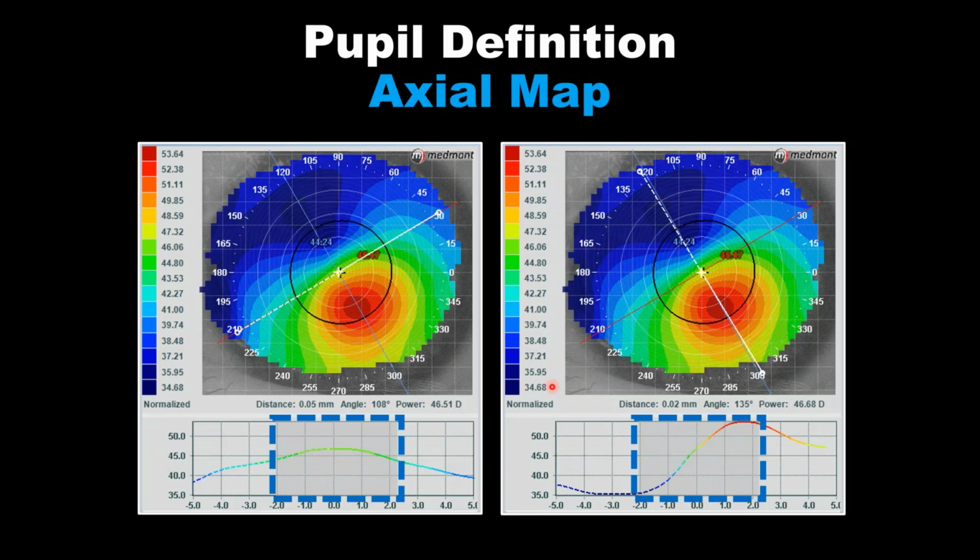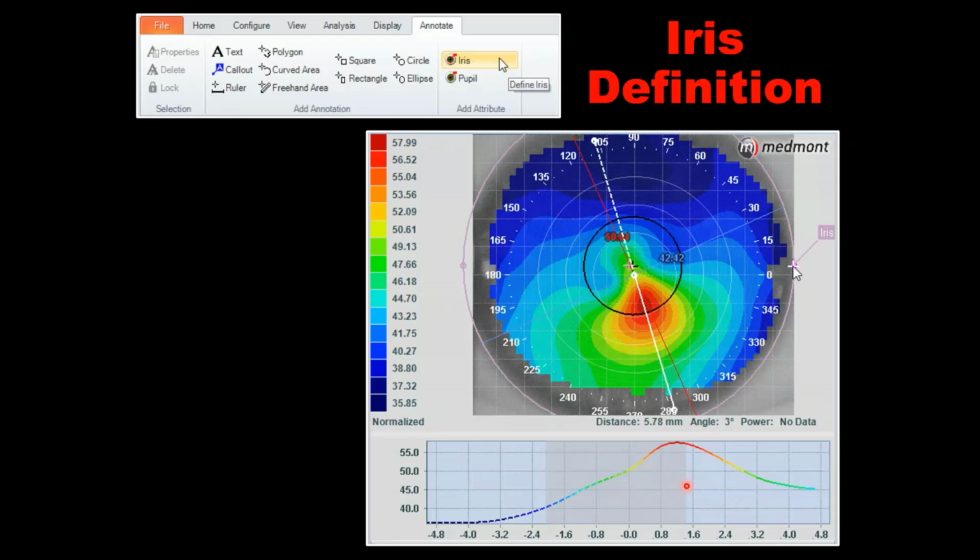So that's around a 19 diopter distribution of power within the pupillary borders. So of course, this is suggestion that this patient may require rigid lens optics to achieve any kind of appreciable quality acuity.